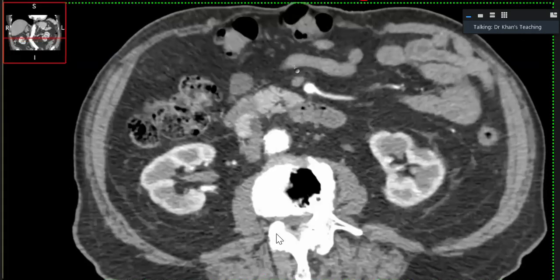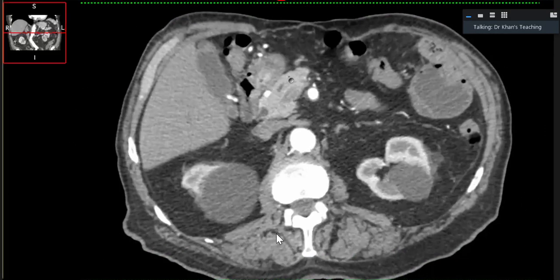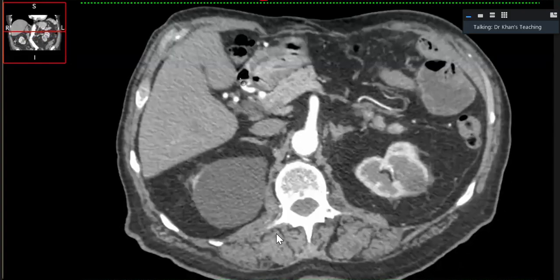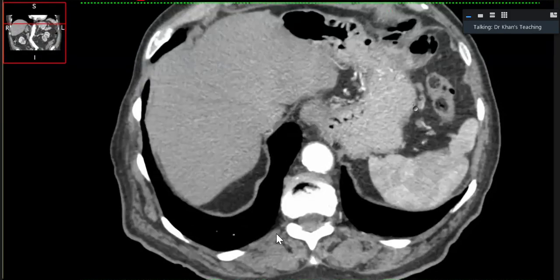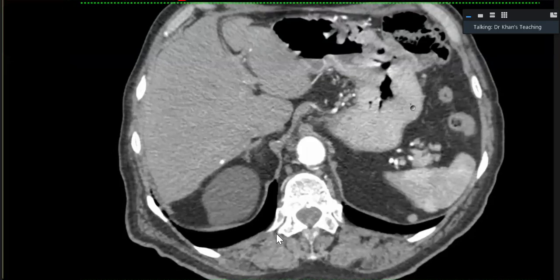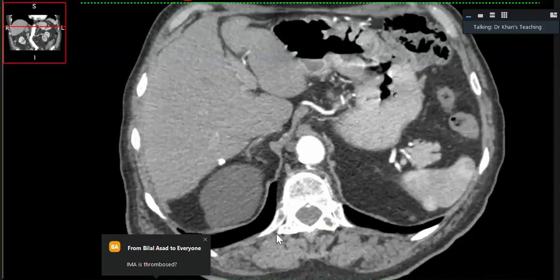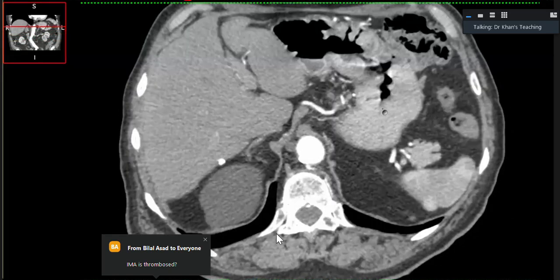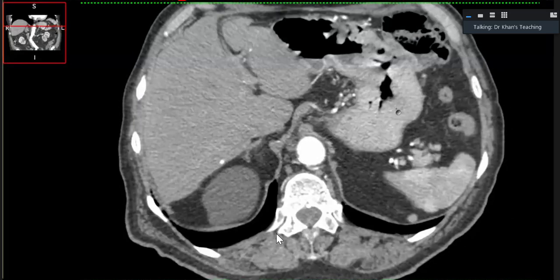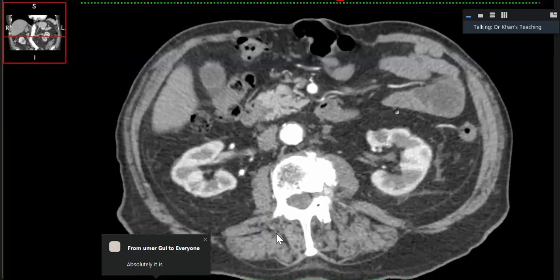First, multiple lesions. You did very well, where you said that you will look for multiple lesions. Second, metastasis. You did very well. But the third thing is to look at the stomach. What do you think is happening to the stomach? You see, these are what we call rugal folds. You have to develop your eyes to differentiate it from wall thickening, but these rugae are thickened. Particularly when you pick up that thing, you can then confidently say that this is suggestive of rugal thickening. So with rugal thickening, it becomes Zollinger-Ellison syndrome. Zollinger-Ellison syndrome.